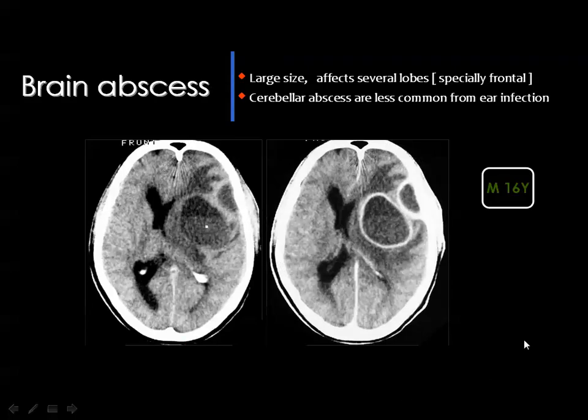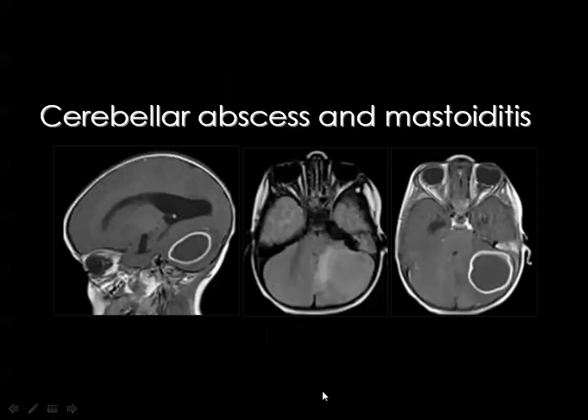Brain abscesses may be unilocular, multilocular, or multiple with a major one and satellite lesions. Usually they show marginal enhancement of uniform thickness, surrounded by variable degrees of brain edema with variable mass effect.